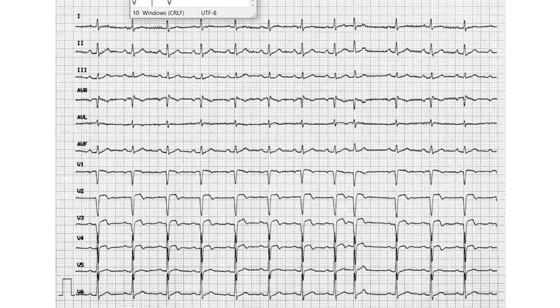Okay, this is roughly regular, with a tolerance of 0.16, of course. Regular, sort of regular. Okay, it's a bit undetailed right now, but it's still regular. It's a bit hard to maneuver with this thing. Roughly regular, irregular, right there. See how much the difference is between the distance between this peak and that one? It is more than 0.16, so we don't tolerate it. So there we can say no, it's an irregular heart rate.